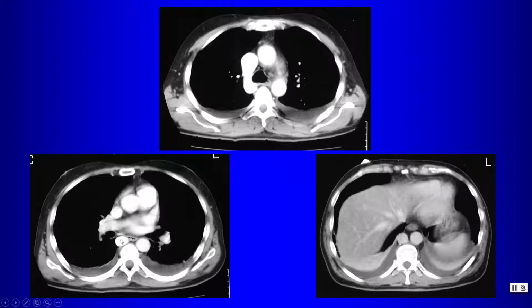And so here it is traveling up the posterior mediastinum. There it arches forward to drain into the superior vena cava. So why does this person have a dilated azygos vein? The answer is on the last image. Here is the dilated azygos vein.